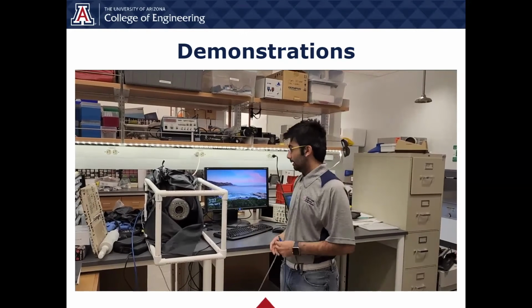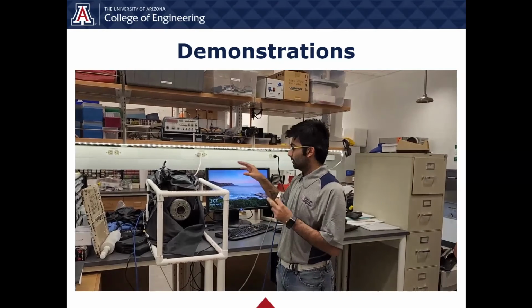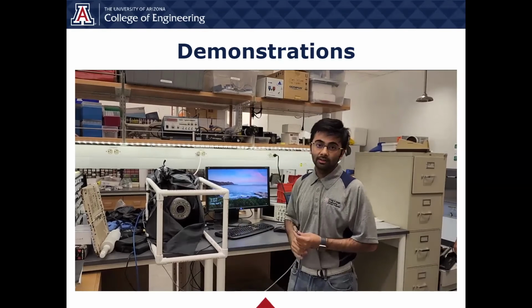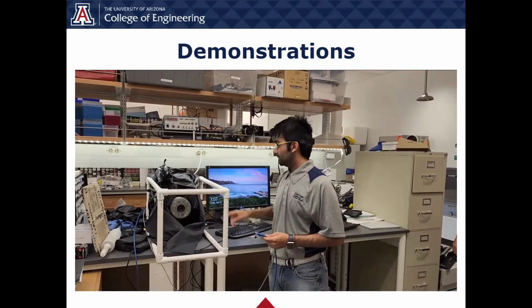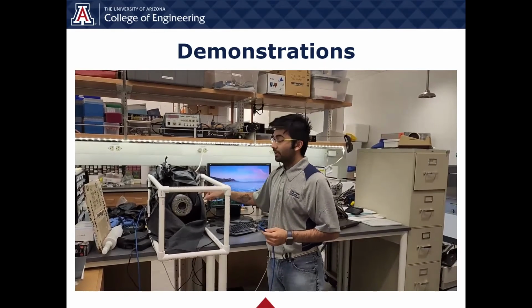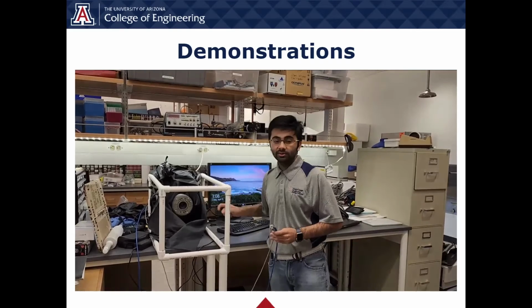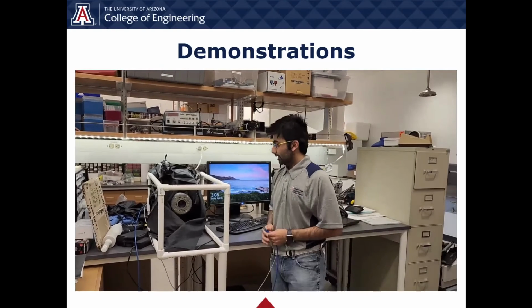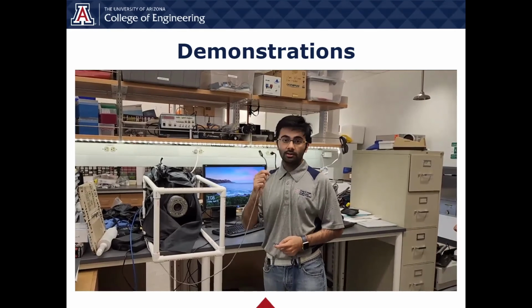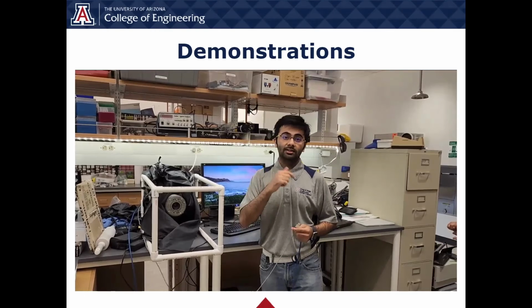Hello everyone. So this is our multispectral imaging system. Here the whole support is made up of PVC pipes, and here we have the camera. The camera is surrounded by 26 LEDs, and the camera is held by the support, which is the housing, and also we have the cooling system. Then we have the blue cable which powers the camera, and the back cover cable which powers the Arduino, which basically controls the whole system when it is connected to the computer.